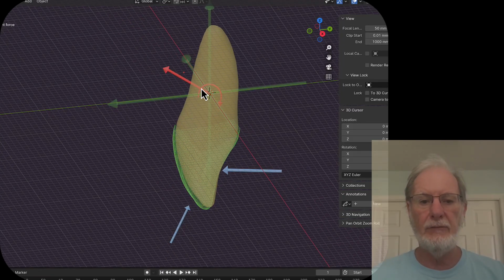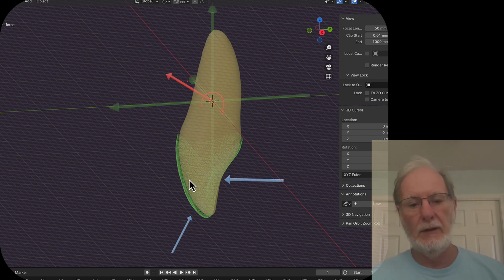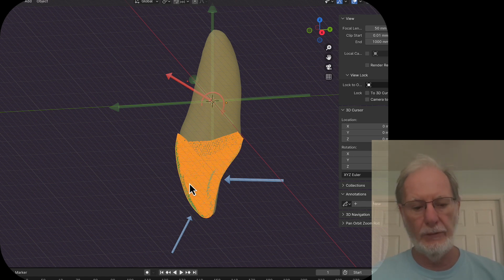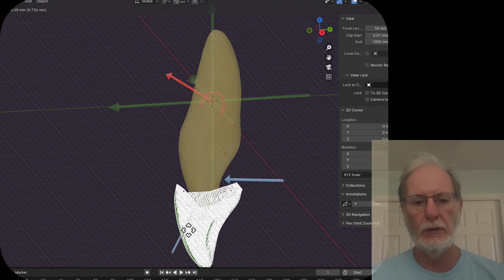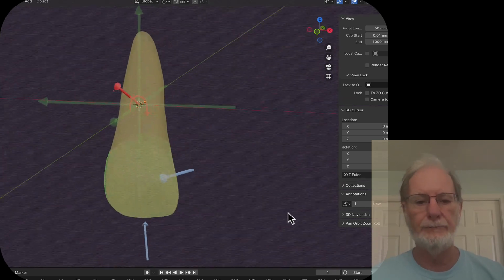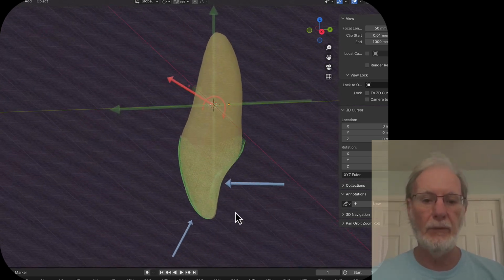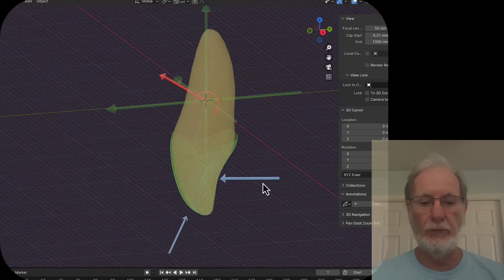And this is the force system you'll get from force F horizontal, force F semi-vertical, force resultant, and moment at the center of resistance. All this comes from the introduction of the aligner. So that's basically what happens. And if this is the movement you want, you have the perfect force system.